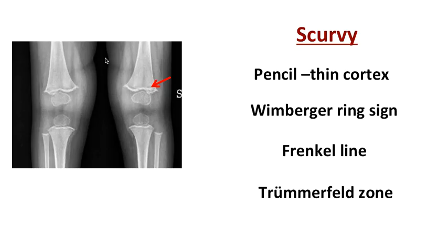This area represents debris of broken down bone trabeculae and connective tissue. This is also known as Scurvy line. Finally, you can see Pelkan spur, which is a lateral projection of white line seen at the cortical end.